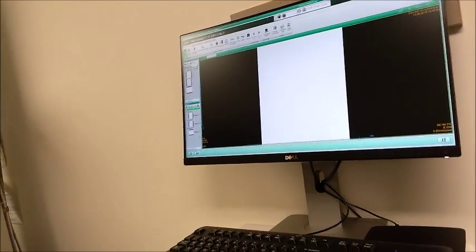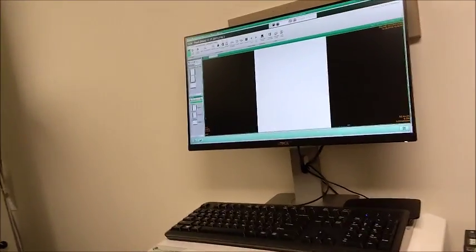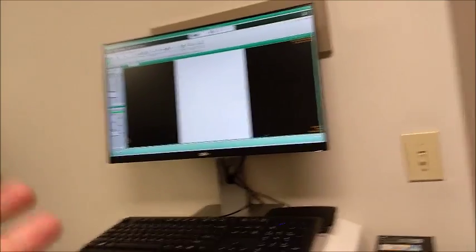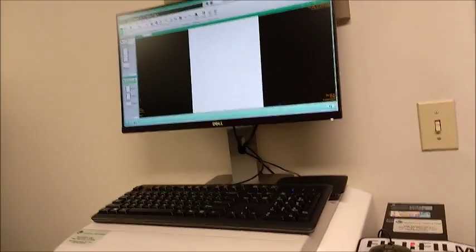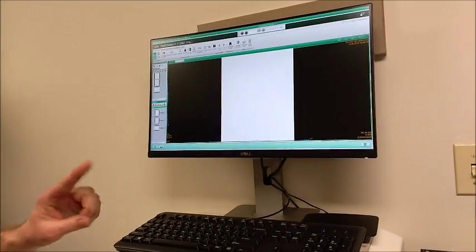That one will be gone. That's right. But it would only be gone over there on the pharmacy computer. It wouldn't be gone for eternity. It would just mean you'd have to resend it all and do it again. Yeah, it'll never ever be gone out of here unless you go in and delete it.